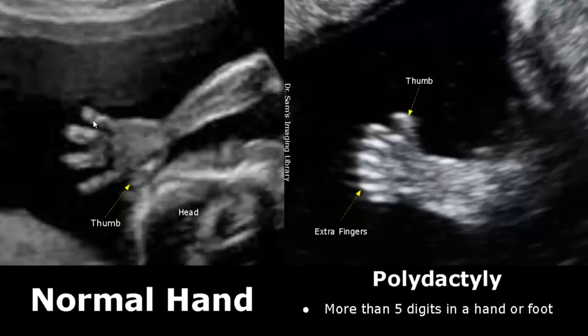On the left side, we can see a normal hand. The thumb and forefingers can be seen normally. This is a case of polydactyly. In this condition, there are more than 5 digits in a hand or foot.